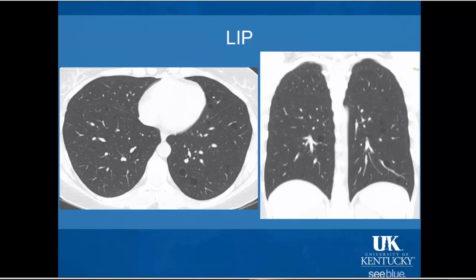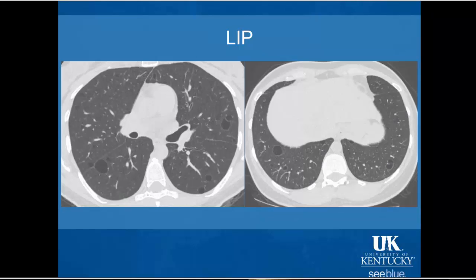And additionally here you also again see some of these cysts butting right up against the adjacent vasculature, again kind of suggesting that perivascular distribution. Here's another example, lower lung predominant, well-defined, small regular, thin-walled cysts, again with that somewhat perivascular distribution. Again, note the relation next to some of these small vessels.